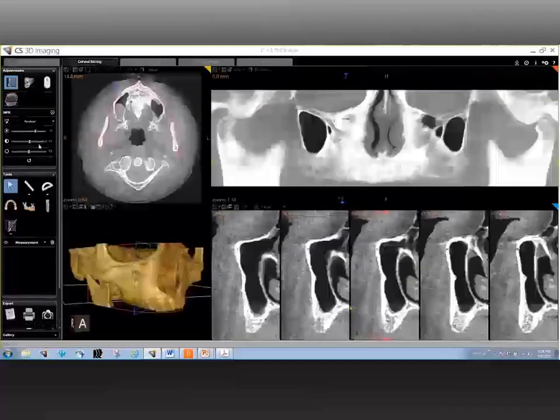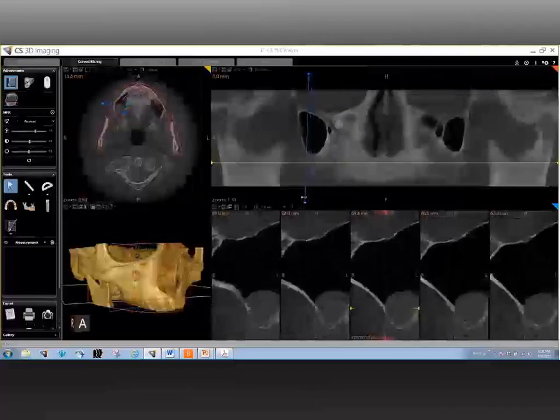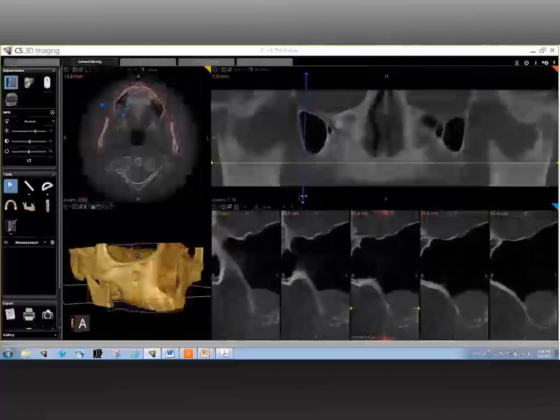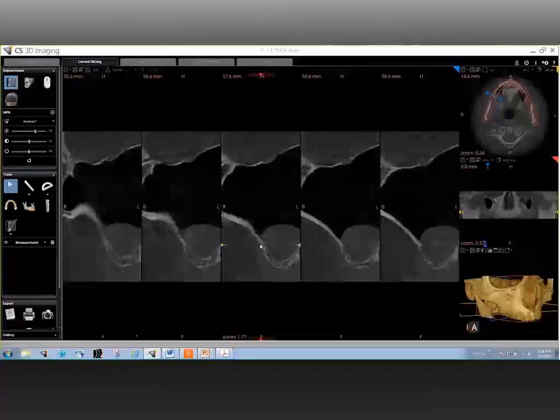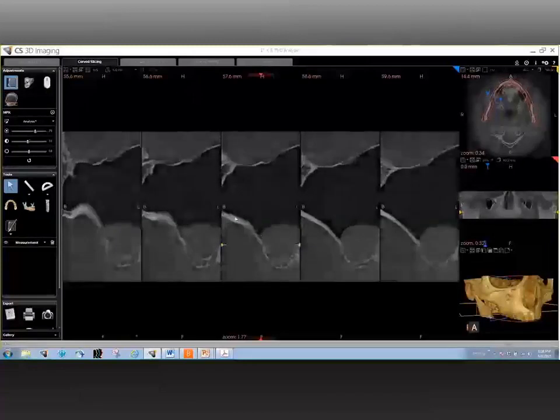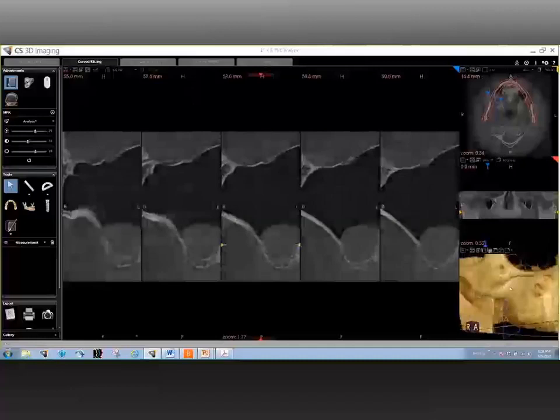Well, if you look at the cross-sectionals, I'm going to go back all the way to the posterior area, and we would use the traditional way of interpretation. The cross-sectionals are one of the most important sections that you would use for implant surgery. These shots show the cross-sectional view of the crestal ridge of the jaws, and by that what I mean is I'm getting the buccolingual aspect, which is a third dimension that is missing in a two-dimensional radiograph.